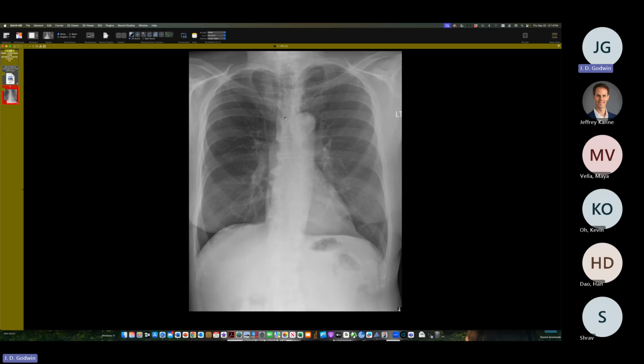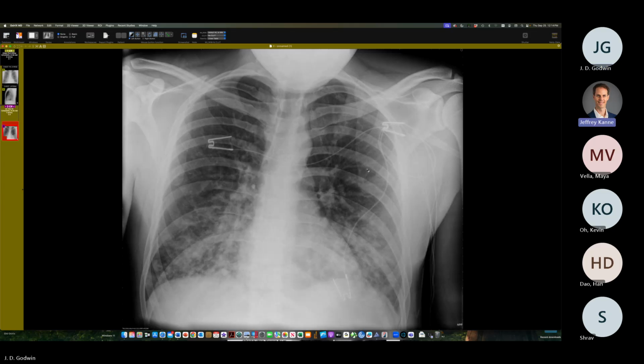This is more elongated than you usually see. I don't have a CT for this case. It was an outside exam sent for a B reading, which was normal. David, why is that one so asymmetric? It's usually asymmetric. So you usually just see it on one side. It usually floats within the arc of the first rib. And it has vague borders to it. Sometimes it has a sharper border on one side than the other.